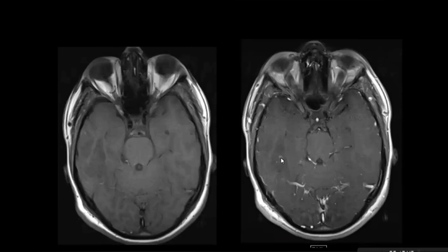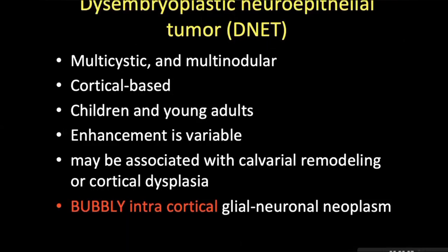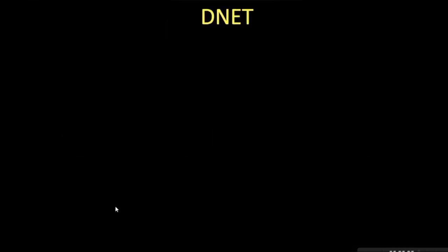Yes, okay. So what do you think? What's the differential diagnosis? My diagnosis is DNET, and differential includes ganglioglioma. Okay, that's good. So you did great. So that is exactly what it is. So this one is DNET. And the ganglioglioma, usually they have a solid component and a cystic component. They have calcification, and they also have an enhancing nodule. So as you used the correct words, you got the full box, bubbly intracortical lesion. Usually they don't enhance, but sometimes they can, and they present with epilepsy. So again, if you have a cortical bubbly lesion, that is just DNET, okay?